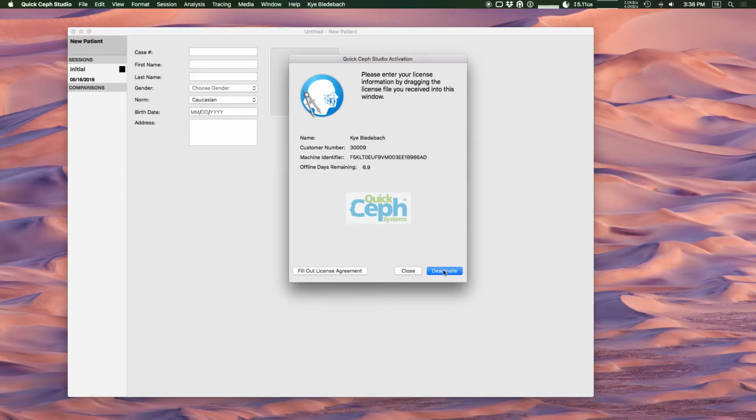You can use the emails we originally sent you for installation, and also if you need help with installing on a new machine, there's a tutorial video on our website walking you through installing Ceph Studio on a new computer.